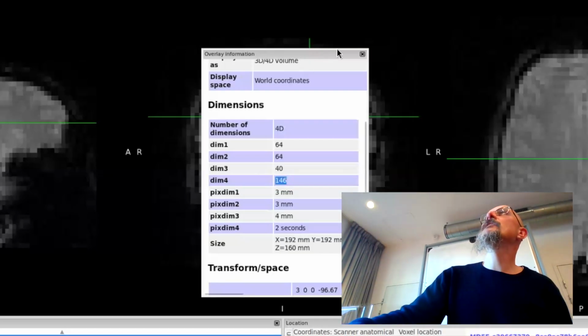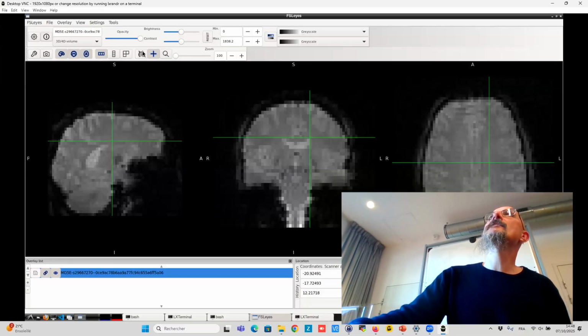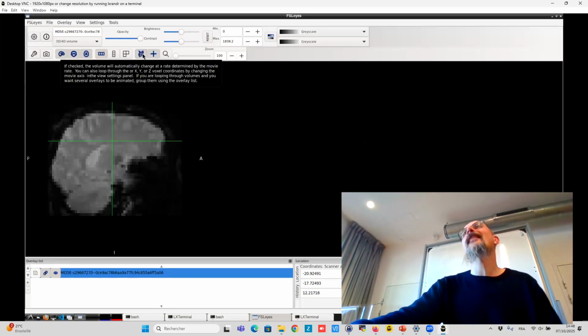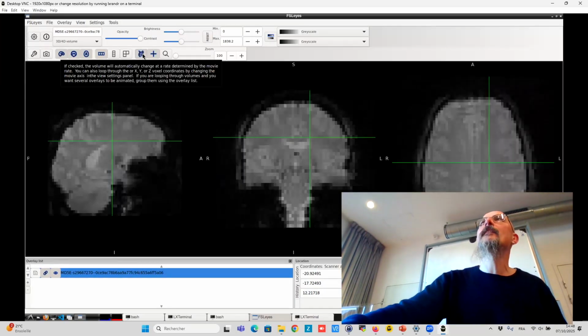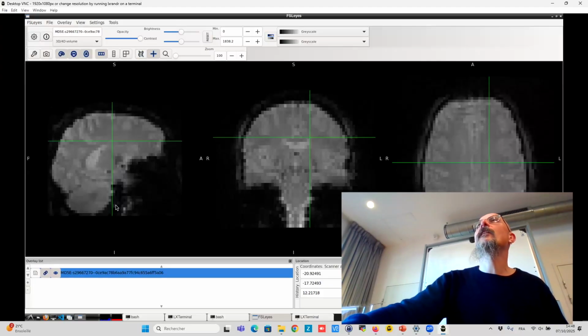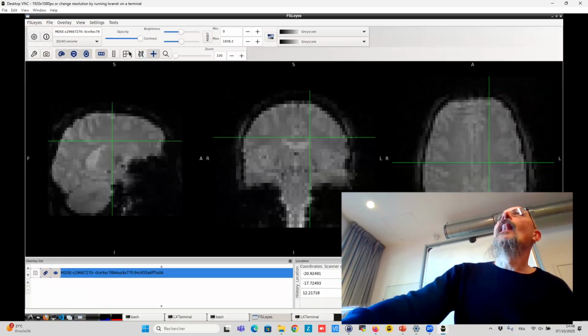Okay. So to see that, you can click on this movie button here. If you do that, yeah, you will see things moving, but as Neurodesk is not really happy with that, we'll stop it. I hope no one is epileptic.